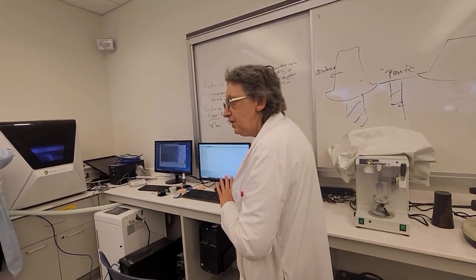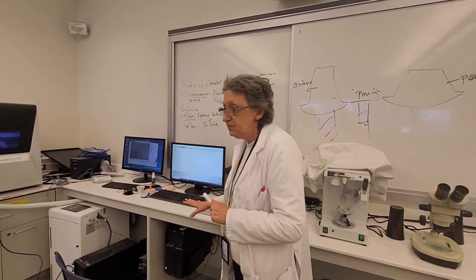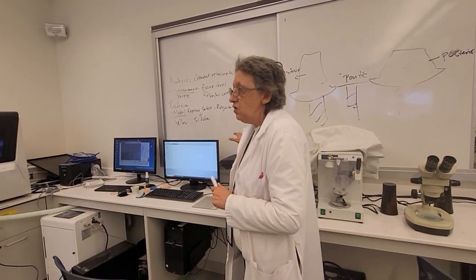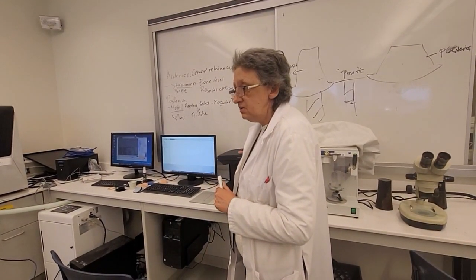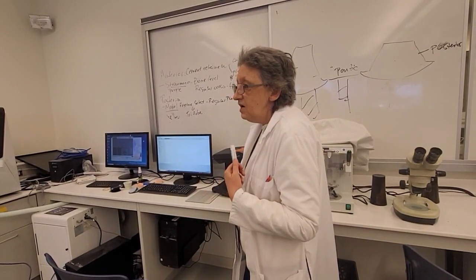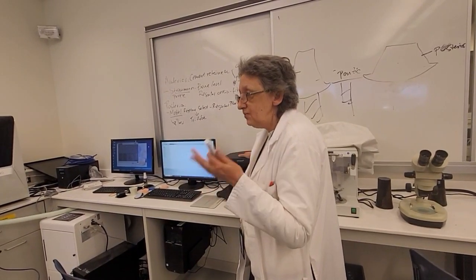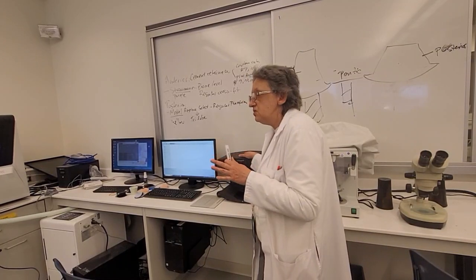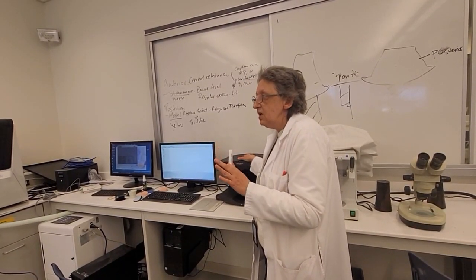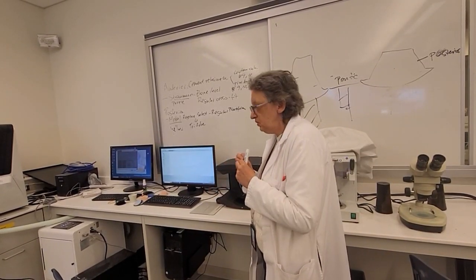In the lab setting, you're going to need a powerful computer, a scanner and the software. We are using a desktop scanner. You can also use an intraoral scanner. For my liking, for implants, especially for complicated cases, I do not like to use intraoral scanners because they're accurate to a certain extent, but the way we move and take the impression, sometimes it doesn't collect all the data that we need.